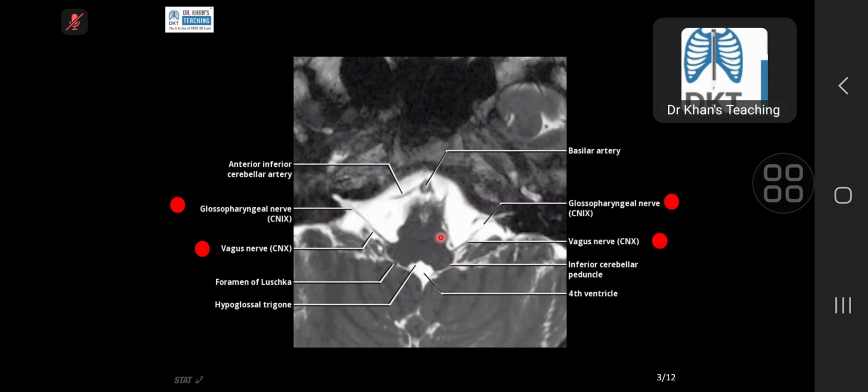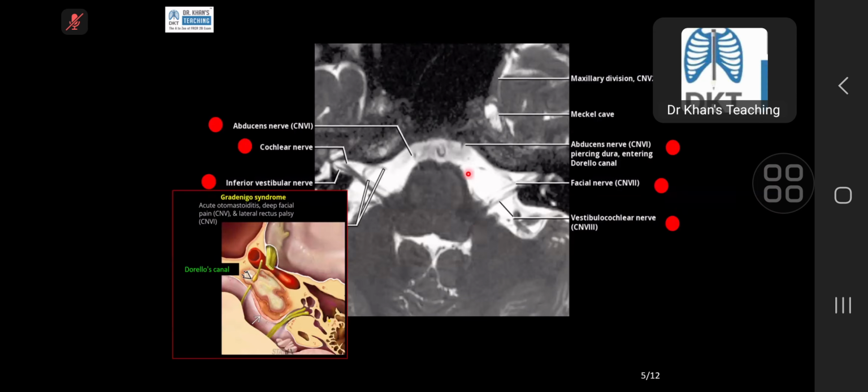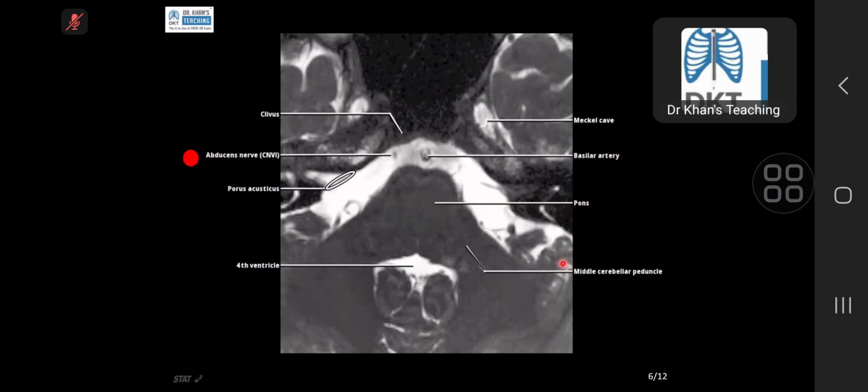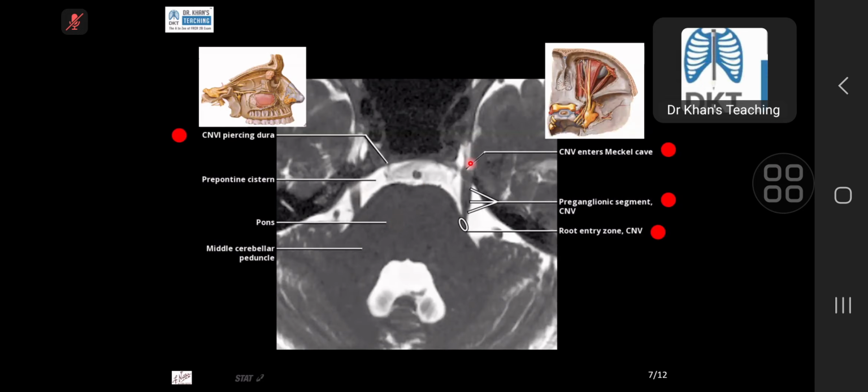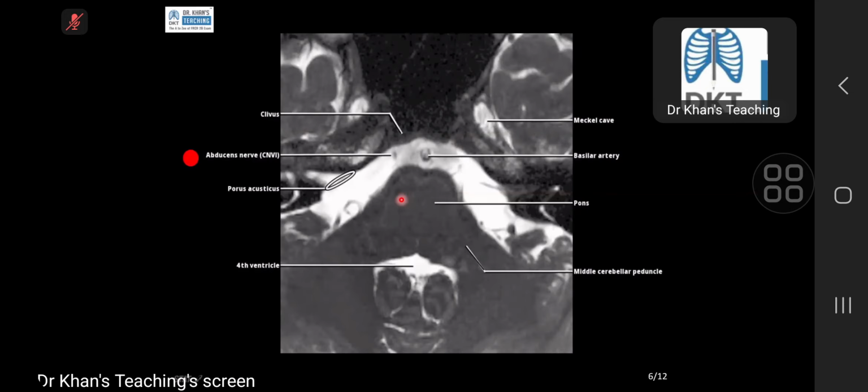You can see from the medulla, various nerves are passing. So here you are. I just wanted to highlight that the sixth nerve passes anteriorly into, this is sphenoid bone per se. It passes here anteriorly through it. So last time I showed you a case of Petrous apicitis. And of course, we know that this is the fifth nerve. This is the Meckel's cave, yes, and the ganglion which sits there. And of course, the seventh and eighth nerve we have already covered last time.